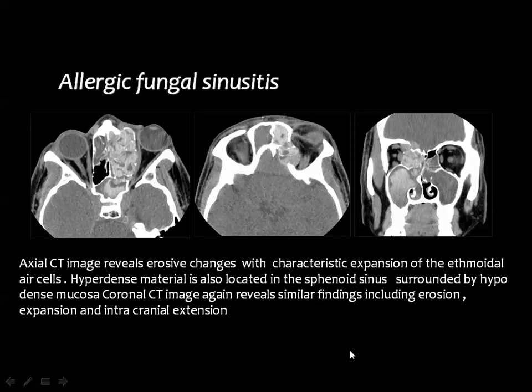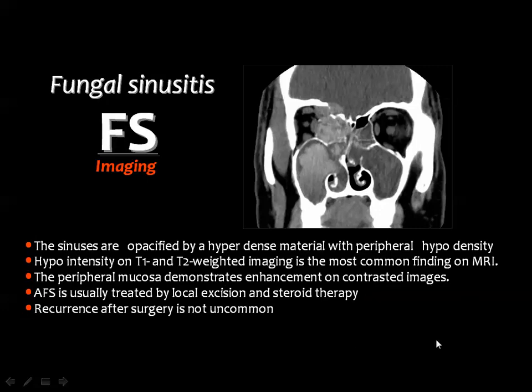Another example of allergic fungal sinusitis affecting the sphenoid, the ethmoid, and the frontal sinuses with little bone erosion of the orbital roof, and some intracranial extension.